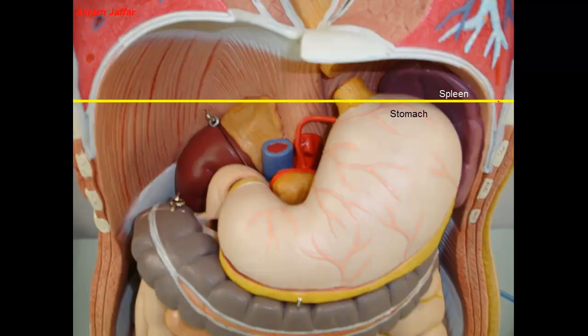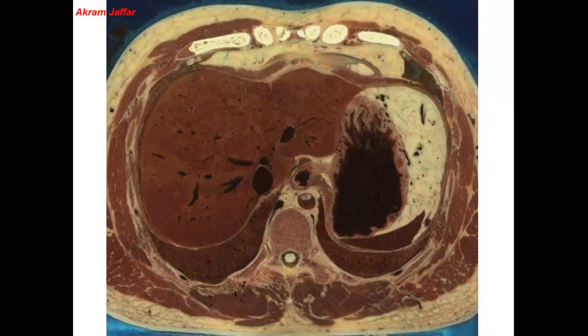But it can still pass through the lower lobe of both lungs. So here, this is the lowermost section that I'm going to describe today. Here there's the liver on the right side. On the left side is the stomach. You can see the rugae of the stomach and the esophagus opening into the stomach. Behind the stomach is the spleen, and behind the spleen is the diaphragm, and behind the diaphragm you can see evidence of the lower lobe of the left lung. And here again you can see the lower lobe of the right lung.